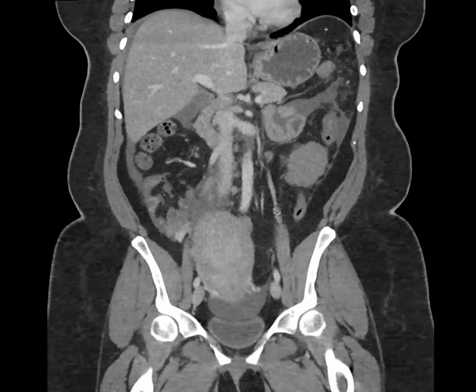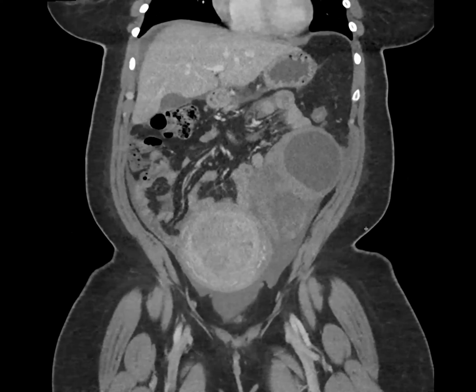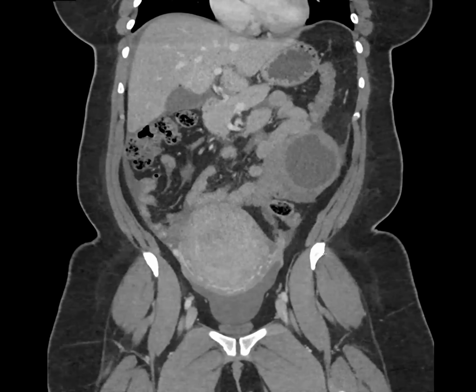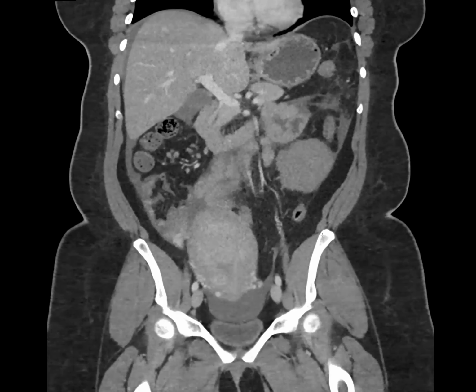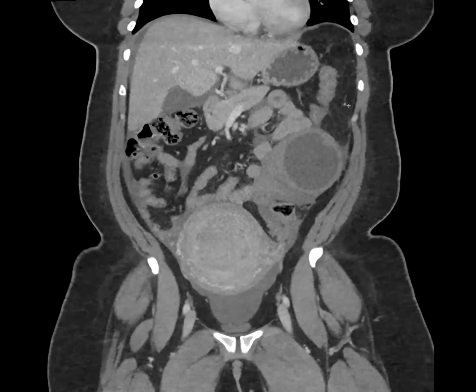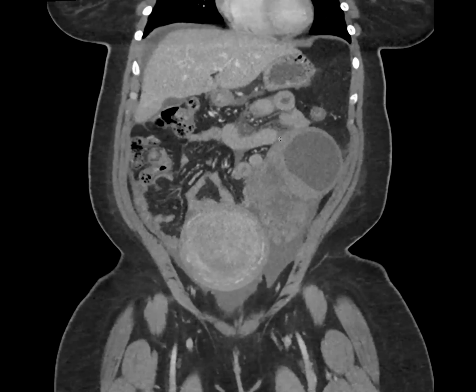And there was also peritoneal carcinomatosis. Yeah, that's what was initially proposed: a large left adnexal complex cystic mass, probable peritoneal carcinomatosis with all this fluid. It turned out to be a torsed left ovary with an ovarian fibroma. This was all edema in the ovary, and this was fluid and reactive, inflammatory findings in the mesentery. So a large ovarian fibroma can cause torsion.